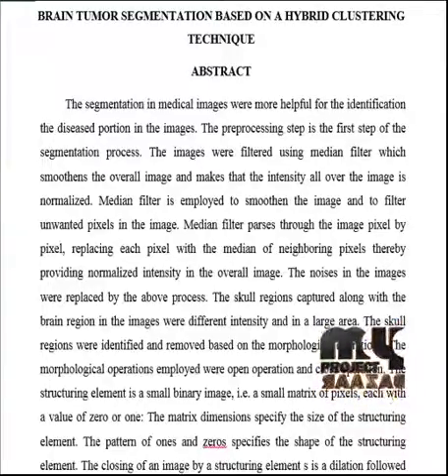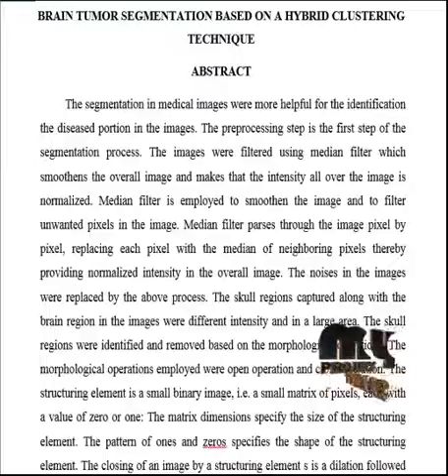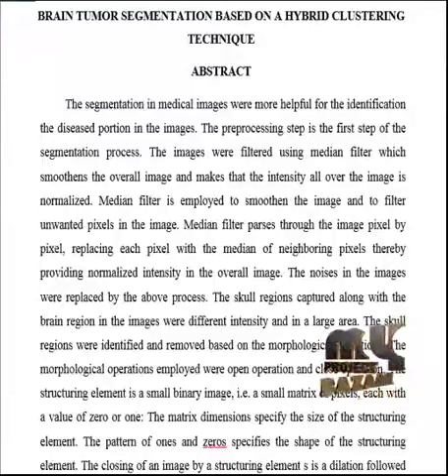Thresholding process is employed for the segmentation of the tumorous portions in the input image. The specific threshold for the brain tumor portion is identified based on the identification of the maximum pixel of the input image. The image pixels that had maximum intensity were identified to be the tumor portions. The threshold value is adjusted such that it is 30 pixels lower than the maximum pixel.